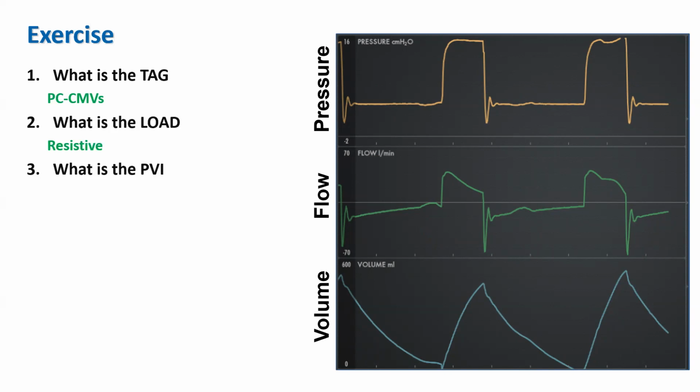So what's the patient-ventilator interaction? How are we going to classify this? What type of synchrony problem are you seeing here? It should be very obvious. It happens all the time once you recognize it. Well, we have possibly a failed trigger over here, but more obviously we see it right here. This distortion in the expiratory flow curve is PMUS. The patient makes an inspiratory effort, flow does not go through zero, the ventilator doesn't know that anything's going on, so it's a failed trigger effort.